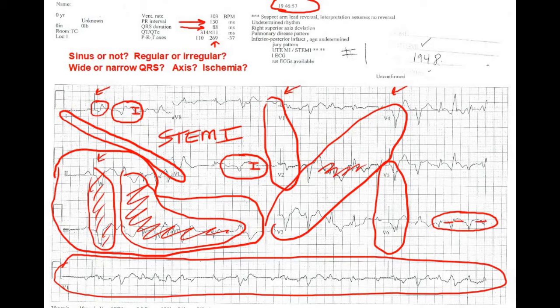It would be great to have better 12 leads and repetitive 12 leads, as well as some additional information, but for right now, I can call this a STEMI. And if we look at what the doc in the box interpreted, you see that magic word there too.